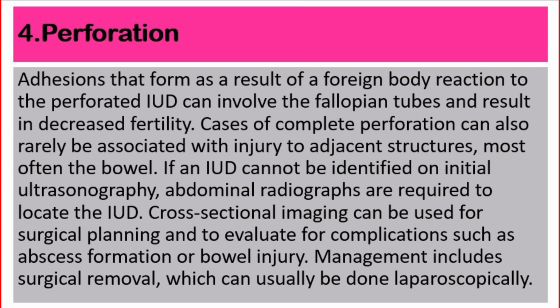Adhesions that form as a result of a foreign body reaction to the perforated IUD can involve the fallopian tubes and result in decreased fertility. Cases of complete perforation can also rarely be associated with injury to adjacent structures, most often the bowel.